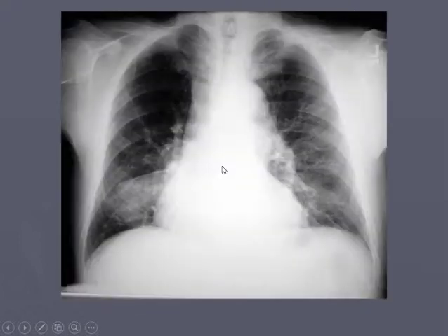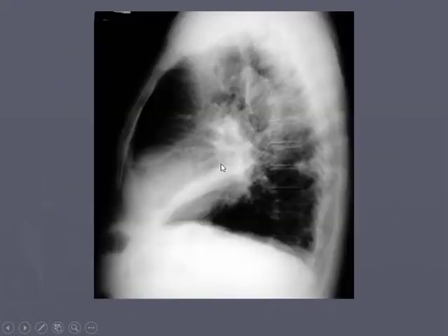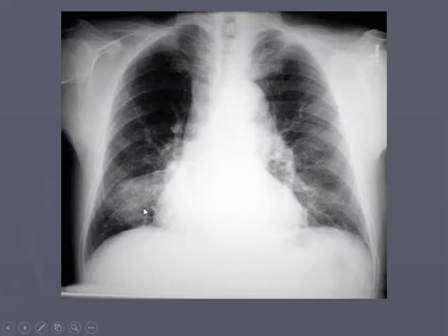And you can say, well, John, who the heck cares? Well, it matters. It matters because then you have to think, well, why are they having atelectasis there? If it's not going to be an aspiration pneumonia, because remember, aspiration pneumonia typically goes right down to the right lower lobe, this could be a cancer.